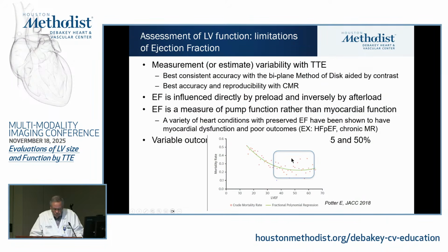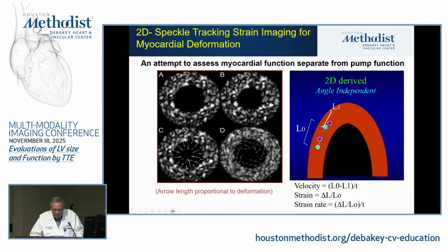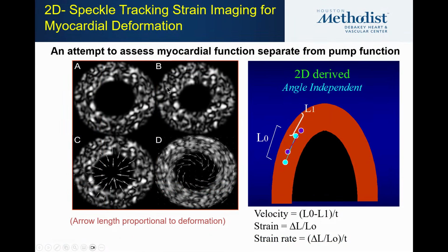So if you can take one pixel and follow the movement of that pixel through time, it went from here to here, okay? Then you can do the measurement in diastole and the measurement in systole between 2 pixels. So these 2 pixels were here, and then they ended up here. So now we can see that that distance shortened by x, which is a percent of y. So that percent shortening in different vectors is what we call strain, okay?